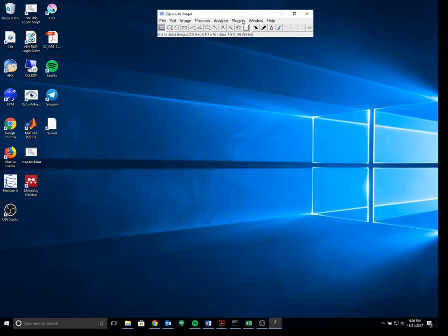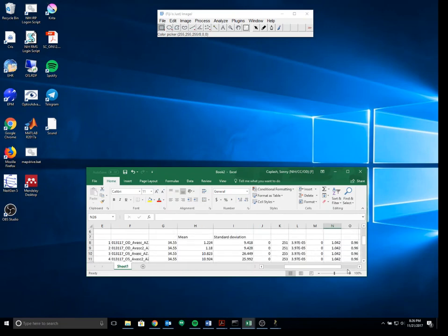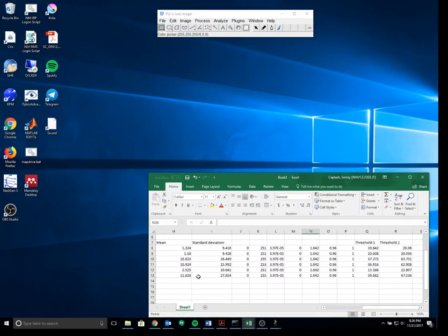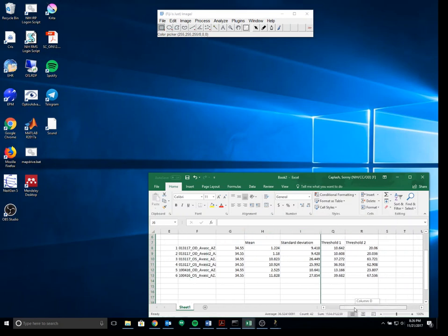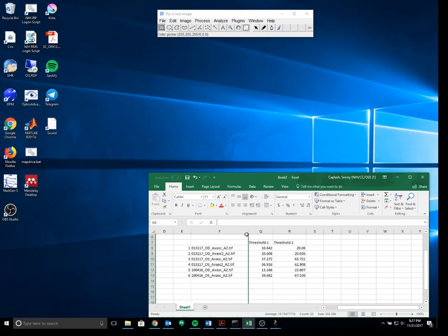Now comes time for the actual flow void measurement. So what you want to do is you want to have this Excel book that has our thresholds. You want to have that handy. So I'm going to put this right here. And then there are thresholds. Let me hide all of this. That's just so I can relay the dates with the thresholds more easily.